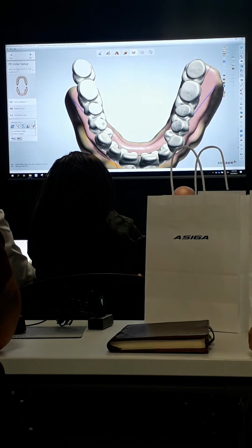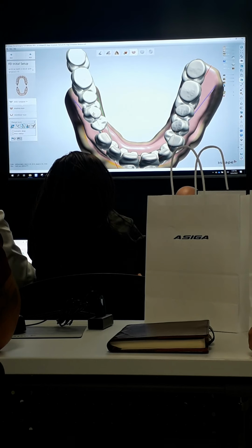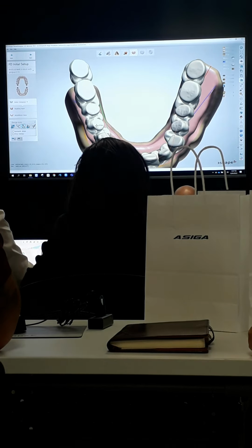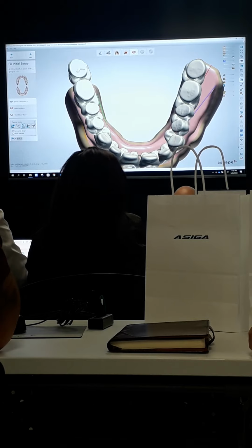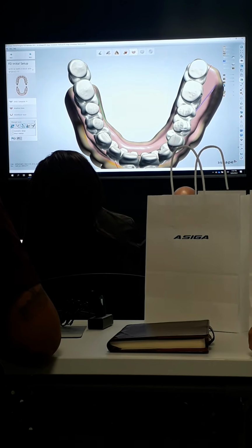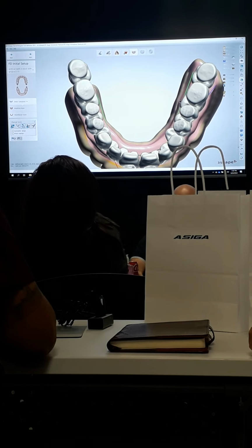But I like to use this more so in the posterior. So let's say I wanted to show a little bit more in the posterior corridor. I'm going to grab from this first bicuspid here, and you can see I can drag this around, but it keeps the upper and lower teeth together in occlusion. So I'm not messing up that occlusal relationship. Let's say I wanted to pull it forward like that. But now that I've pulled it forward, maybe these teeth are out of alignment back here. If I grab from the last molar, I can tip and tilt those in and out, so I can get that right over that ridge. Same thing over here. Position that right over that ridge. And that's why we use Pound's triangle, because I can see the zone that I need to have those posterior molars in with these lines.